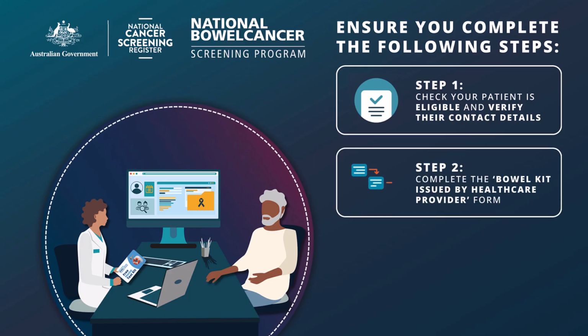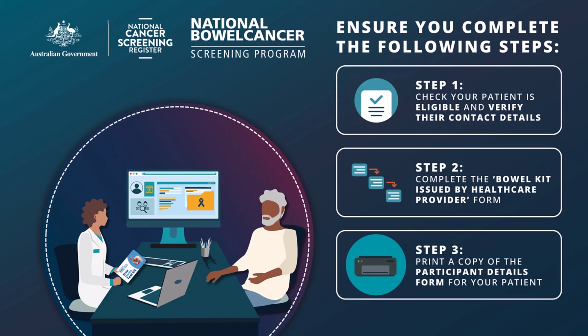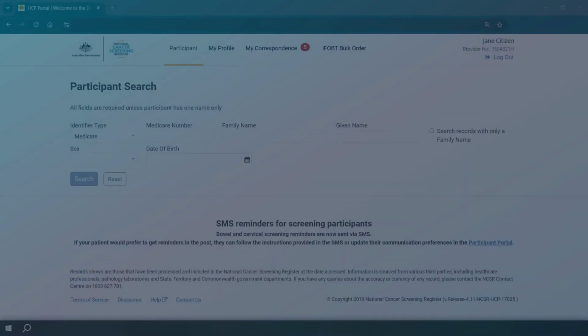Then complete the bowel kit issued by healthcare provider form to generate a unique pre-populated participant details form. Then print a copy of the participant details form and give it to your patient to sign and include with their samples in the reply paid envelope, which is enclosed with the kit.